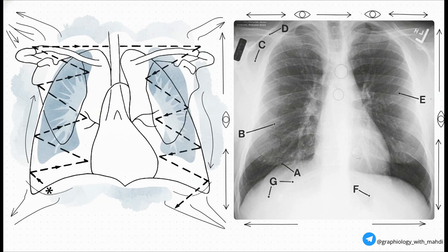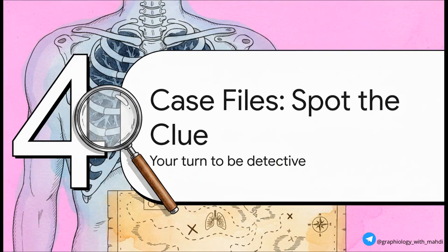This discipline is what stops you from missing those tiny, subtle, but absolutely critical findings. All right, enough theory. You've got the map and you've got the system. It's time to put you in the driver's seat. In this section, you're the radiologist. I'm going to give you a case, and your job is to use your new skills to spot the clue.